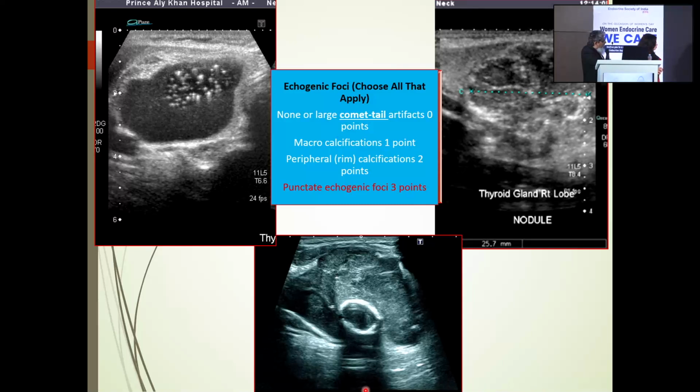And the last is sometimes you get an echogenic rim-like calcification which is coarse, but previously this was labeled as benign. But if there is a surrounding mass or if there is any breach in this rim, then again it becomes suspicious. So I think these three patterns of calcifications are important. One is purely benign and the other two would show you abnormality.